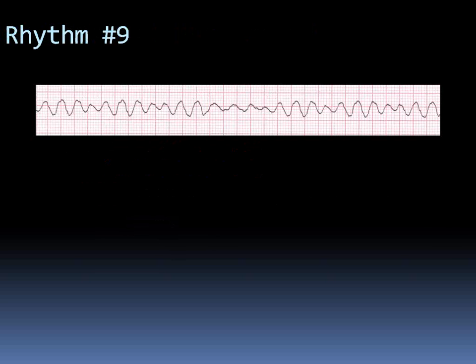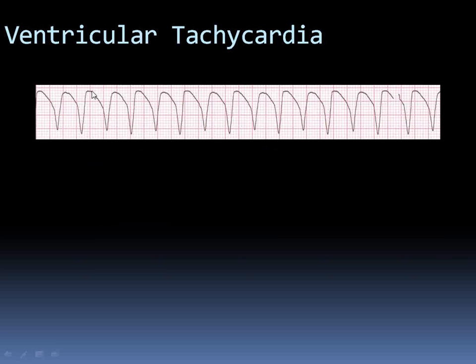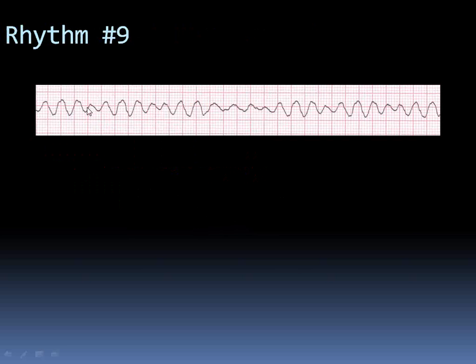Once again, this is another dangerous looking ECG, and this is the ECG of a patient in ventricular fibrillation, as compared to the previous ECG in which you could see regular QRSs going up and down, up and down. This ECG over here has a very wavy baseline. It is up, up, up, down, up, down. There is no consistent QRS morphology. It is all over. It is extremely fast. Remember this pattern. This is a pattern consistent with ventricular fibrillation.